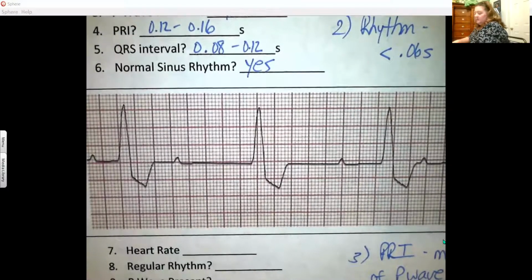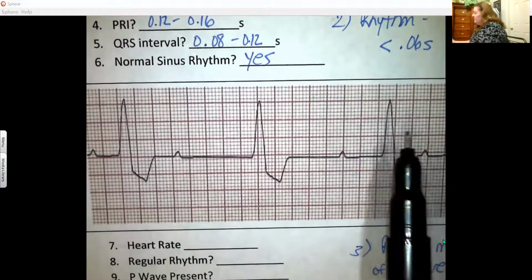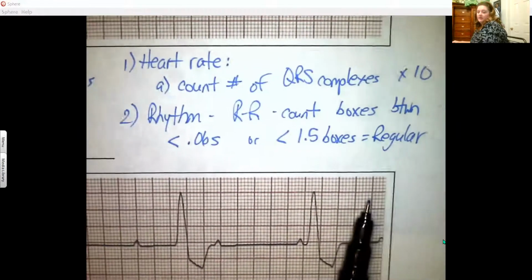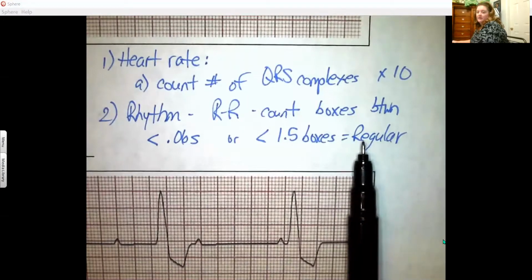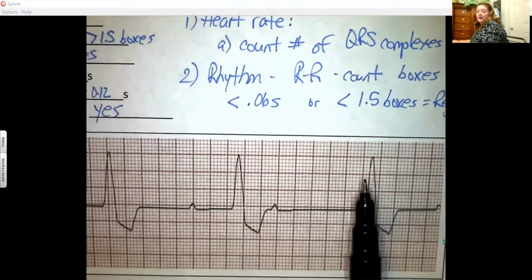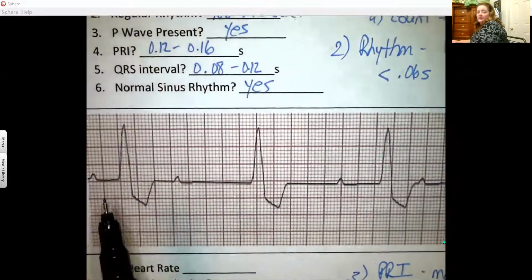So we take a look at this, and we're looking for heart rate. If we check it, you have just a little over 6 seconds. So you can stop it at that. I believe this is the last one, but you can stop it at that 6 seconds. You won't look anything past that. But these all do fall in the 6 second range.